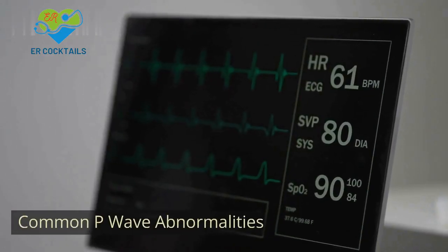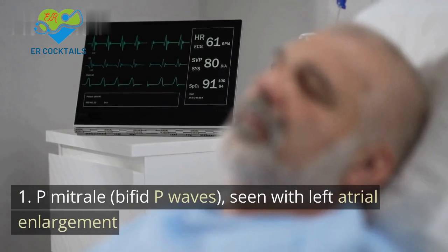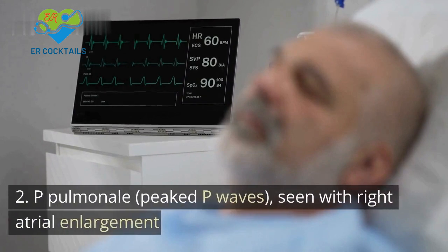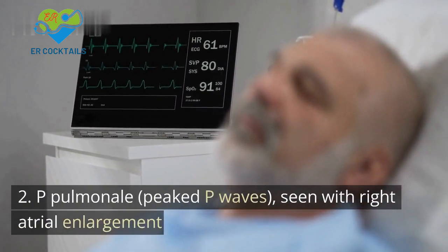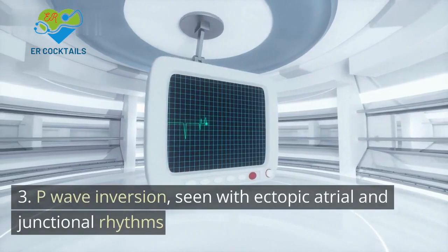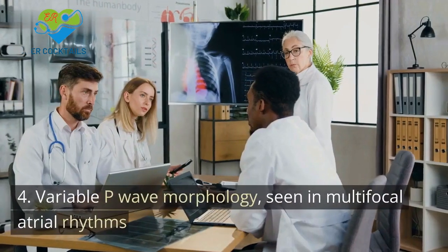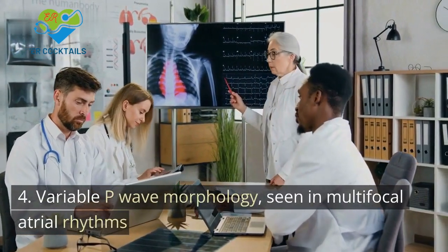Common P wave abnormalities. 1. P mitrale, bifid P waves, seen with left atrial enlargement. 2. P pulmonale, peaked P waves, seen with right atrial enlargement. 3. P wave inversion, seen with ectopic atrial and junctional rhythms. 4. Variable P wave morphology, seen in multifocal atrial rhythms.